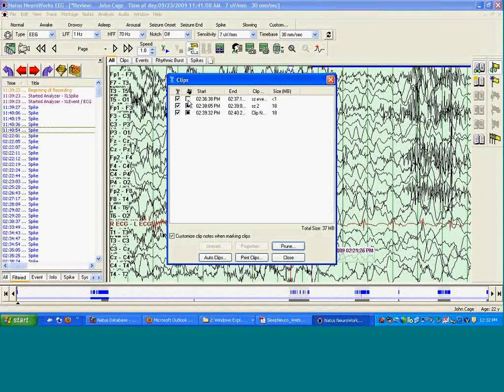So there are 3 toggle points. Left click once, you get a solid square, you will get your full video quality. If I left click on it again, you get the half shade, which compresses it and reduces our file size to 2. And if you left click on it again, it removes video altogether from your clip.